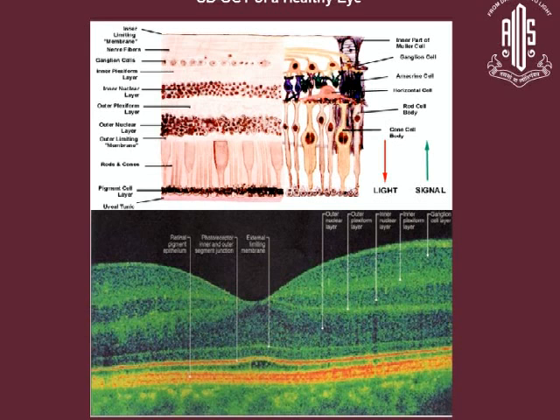Light passes through the optically clear space, meaning the vitreous cavity does not backscatter light, so it appears as optically clear space. One thing about this OCT is that when there is a change in the refractive index between one layer and the other, more light is reflected, and the horizontally placed layers reflect more light. That's why the RPE-choriocapillaris complex looks like a higher reflective layer, and the nerve fiber layer also looks like a higher reflective layer compared to the vertically oriented layers like the photoreceptors.